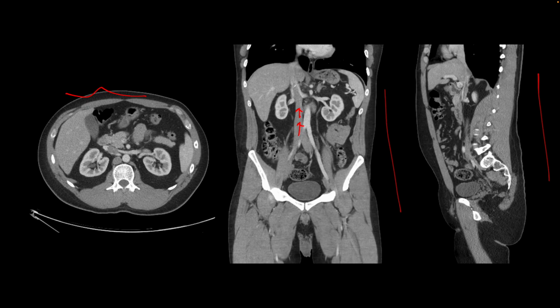And superior to that, we see the blood flow coming from the kidneys, which is excreting the IV contrast into the venous blood from both sides, opacifying the IVC. And so I've seen residents report this right here as a filling defect, also right here, and calling it a deep vein thrombosis. And so remember that this is just a mixing artifact and not a deep vein thrombosis.